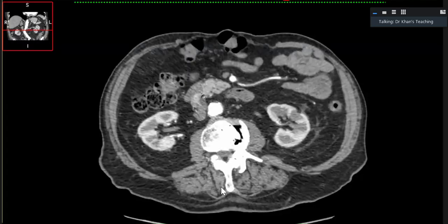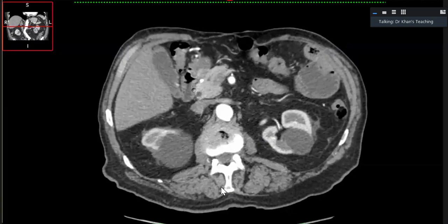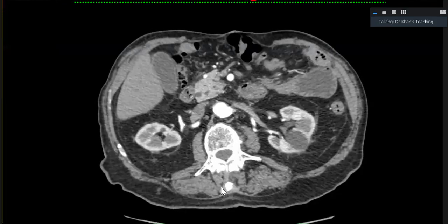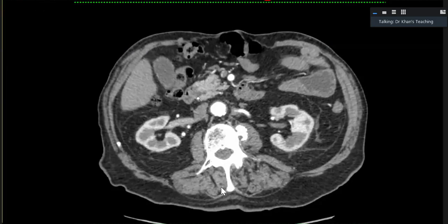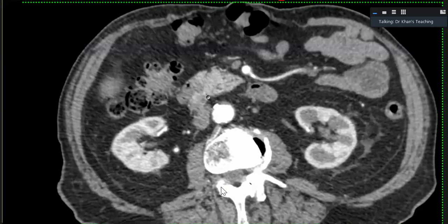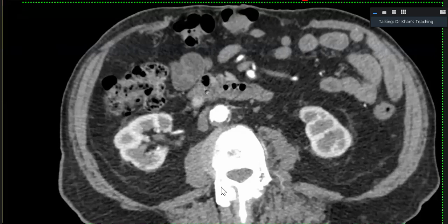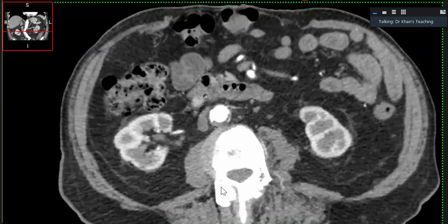This is the head. Now, look at the duodenum. This is D1, this is D2. D2 is sitting here, and this is the CBD where I am pointing. The pancreatic duct comes here. So still we are at D2, and you can see this is the pancreatic duct. It joins the CBD. So this is the ampulla, still the duodenum, and this mass is sitting here. Just concentrate on the duodenum. Now, the duodenum goes and gets connected with D3. So it is sitting outside the loop of the duodenum.